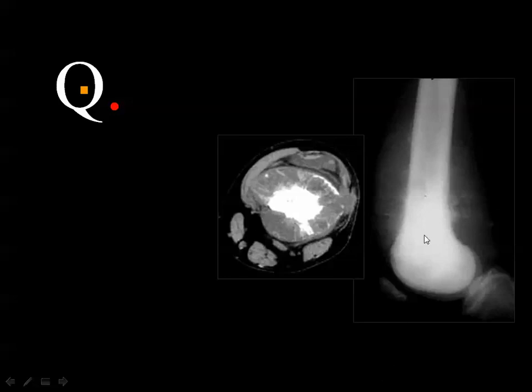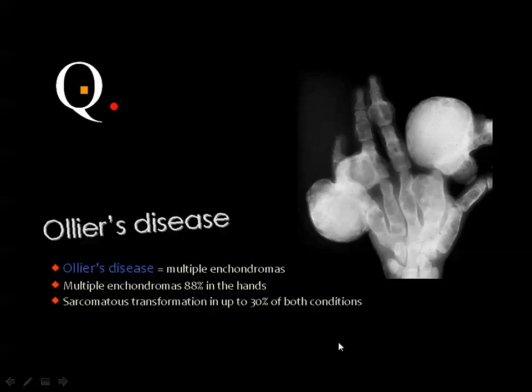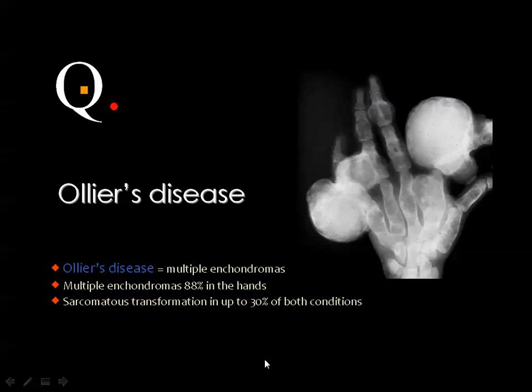And there is a sclerotic lesion in the distal part of the femur with sun-ray spiculation, extraosseous soft tissue component, and the component is evident in the CT scan, diagnostic of osteosarcoma. Yes, multiple enchondromas of the carpals, metacarpals and phalanges with no soft tissue swelling or calcification, and this is multiple enchondromas diagnostic of Ollier disease.